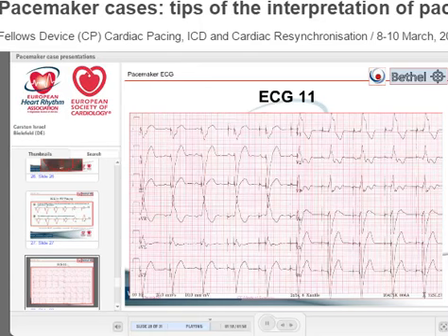What do you think? Where is the ventricular lead? So look at V1. Does this look entirely like a left bundle branch block? Not really, right? Unfortunately, we had only lead 2 during implant, and that looks like apical pacing. But V1 is clearly, where are you pacing? This is one of the largest right bundle branch blocks I know. So this must be in the left ventricle. No question about it. And in fact, aVR is positive, so it must be rather at the tip.